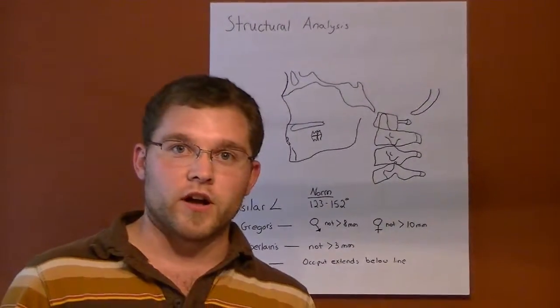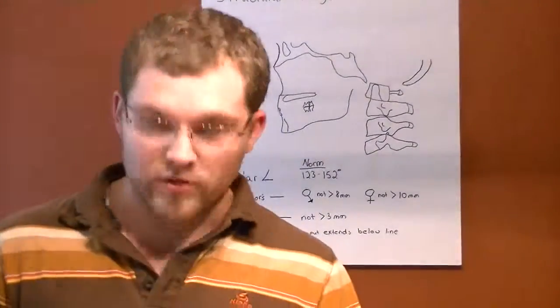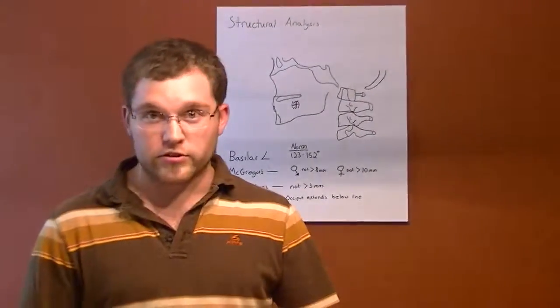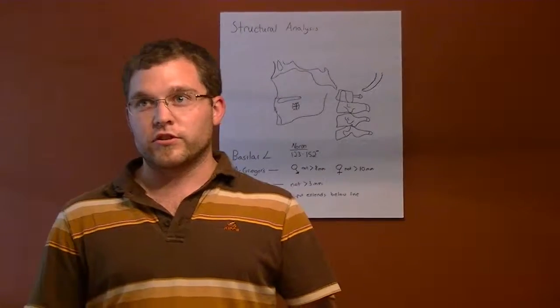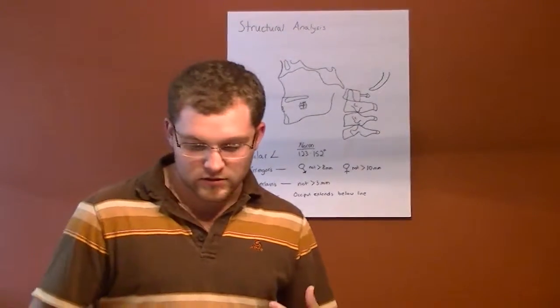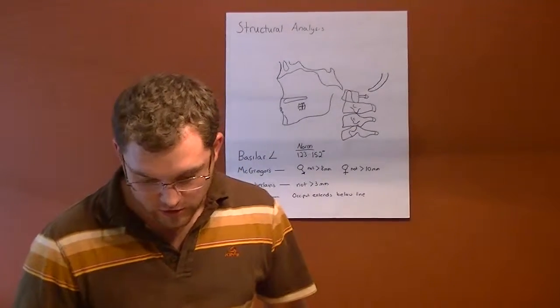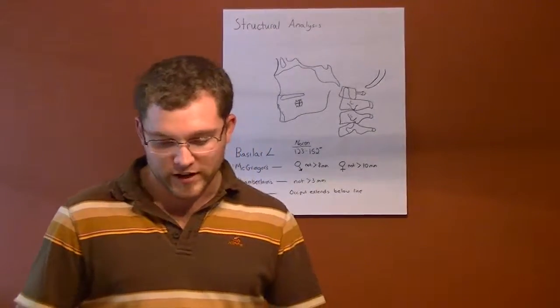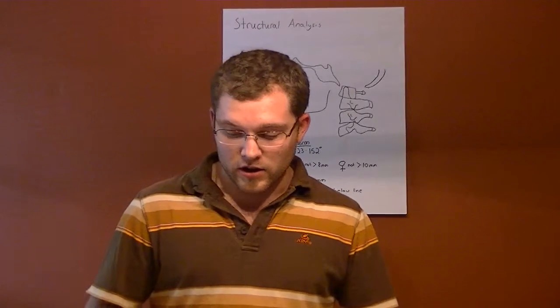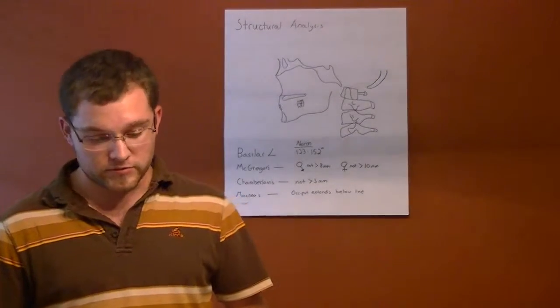Next, we discuss the prevertebral soft tissue and the interspaces. The most common, like we've discussed in normal RADD 1, are the tracheal interspace, the laryngeal interspace, and the pharyngeal interspace. Dr. Bradshaw mentioned that the C4 region, where the thyroid is typically located, the interspace will jut out. Also, the patient will complain of food getting stuck there, and the most common cause of this is a severe lipping or spurring of the vertebral body pushing out into the space. Another cause could also be a space-occupying lesion.